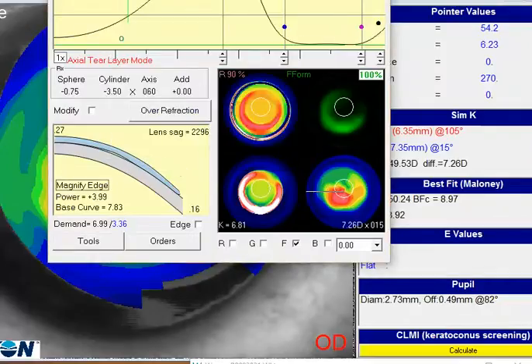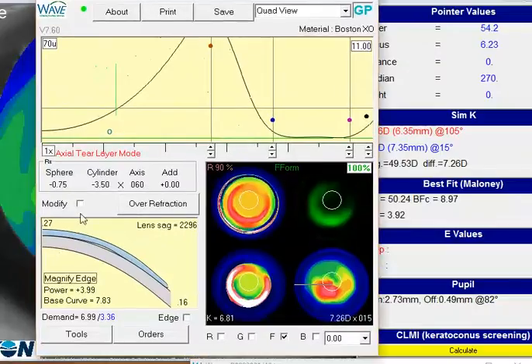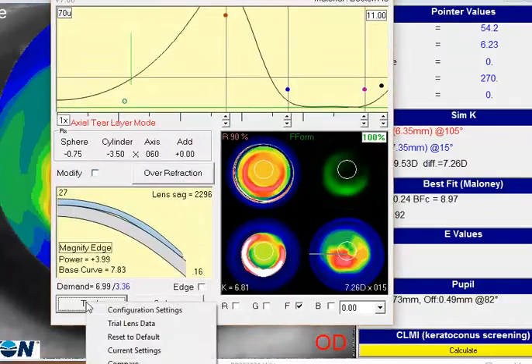And on the same note, if I'm looking at these patients, if I'm pretty sure this refraction is way off base from the true cornea, I'll sometimes actually leave the refraction out of here. Or if anything, just put the spherical equivalent under sphere, but basically take the cylindrical component out, still get the nice best fit based on your topography, and then I'll still go back and add in the trial lens data that I got from that original spherical lens.